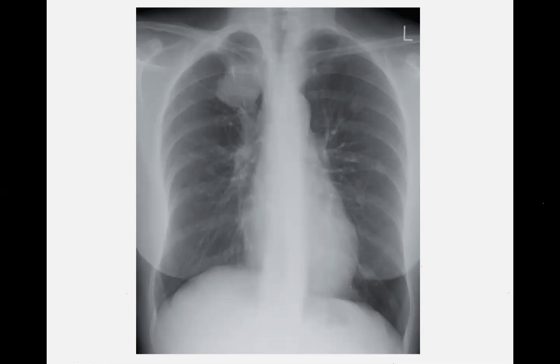لا هذه posterior anterior لان مثل ما انت شايف السكابيولا اللي هم العظام اللي ورا الظهر مو مغطين على الرئه. You can see they're not overlapping the lungs from behind, so that means it's posterior anterior. And the heart is not occupying 50% of the diameter of the rib cage from here to here.